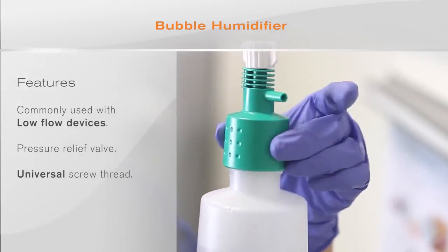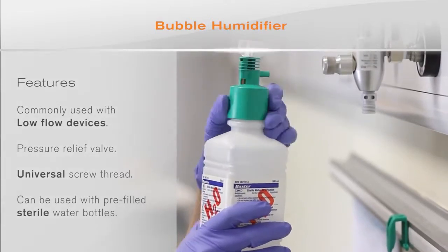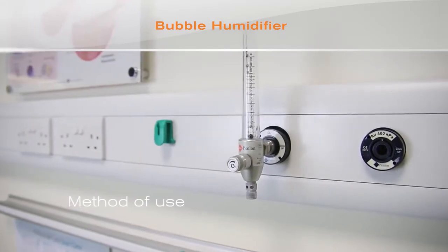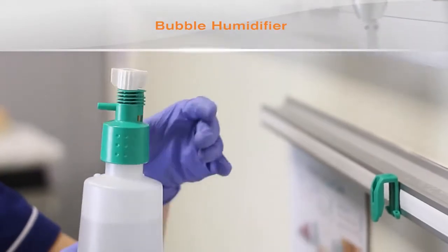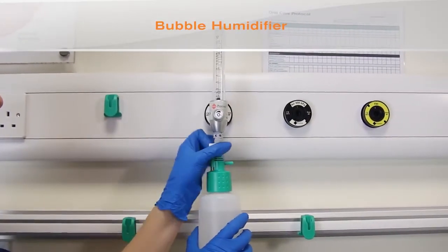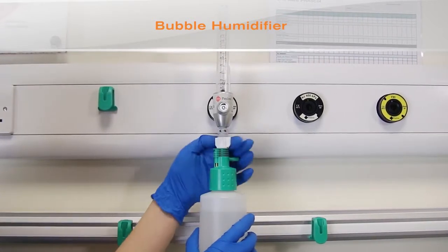This permits the use of a bottle which can be refilled with sterile water or the use of some pre-filled sterile water bottles. The flow meter should be attached to an appropriate oxygen supply. Fill the bottle with sterile water using an aseptic technique and fit to the humidifier head, or fit a pre-filled sterile water bottle. The humidifier should then be attached to the flow meter.